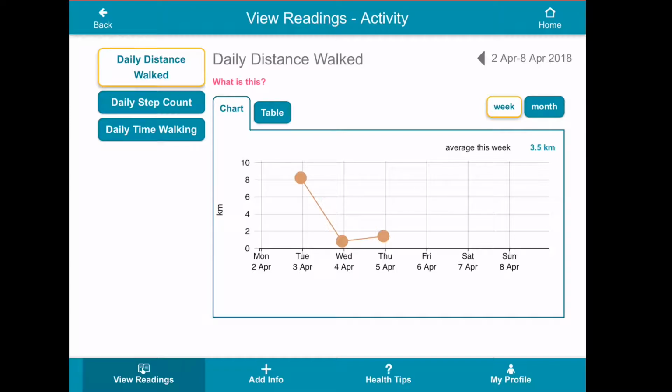This is just a way of showing you what time period the chart is displaying to you. You will also notice that on the chart itself you will see lines that are connected by circles. These circles represent a specific day and specific reading or measurement. We call them data points. If you press on any of these circles, you will see the exact date and reading or measurement that it is referring to.